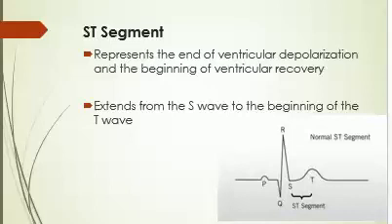And so if you look, it's flat on the isoelectric line. If it goes up or goes down, then we start to think about if this patient has had an MI.